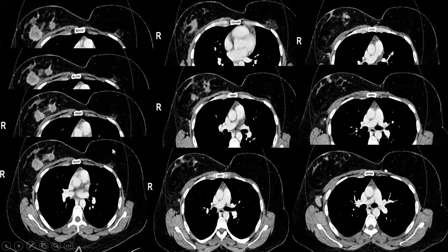This is the ductal extensions, and these more anterior multiple satellite nodules, you see, this is abutting the nipple with nipple enhancement, suspicious for nipple involvement. And look here, even this satellite nodule very close to the nipple, okay? And these are multiple lesions here.